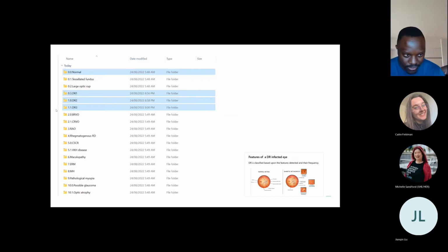DR3 is when it's severe and also very proliferative, in the sense it's spread quite a bit already. And so in that case, it's quite urgent, and intervention may be needed quite urgently. And so these are all positives, but they're classified under DR1, 2, and 3. And so I thought, let me try training. Why don't we train our model and see, rather than just identify all of them as positive, have 3 separate positive tests. I had a link to that, but I think generally you get the point. So 1, 2, 3, you can actually distinguish them in terms of the features that are there.